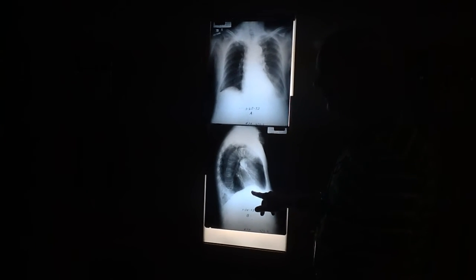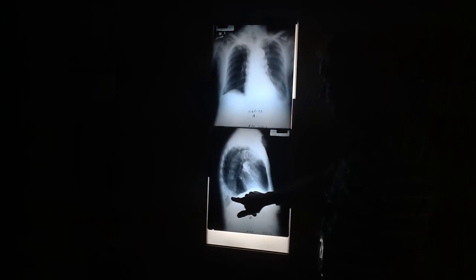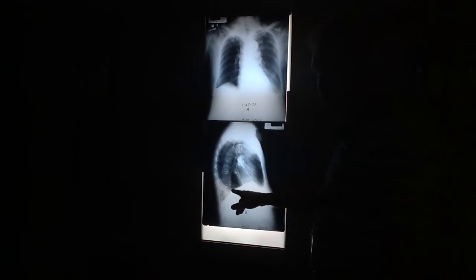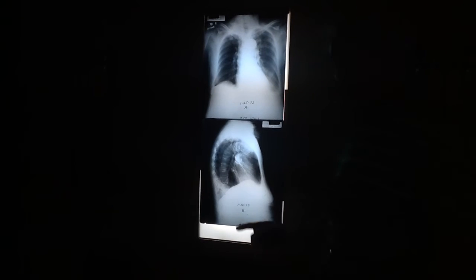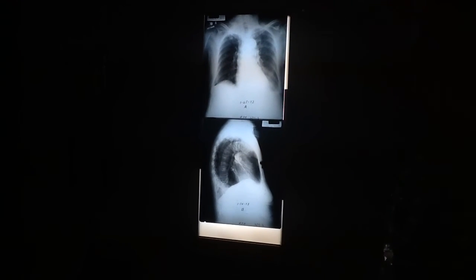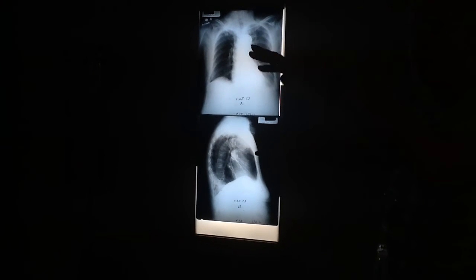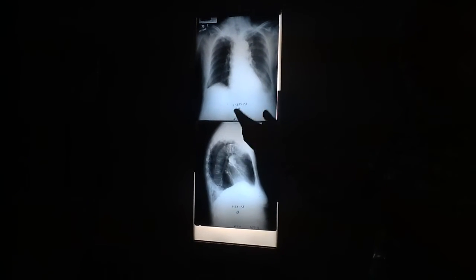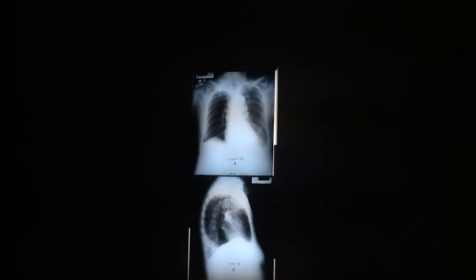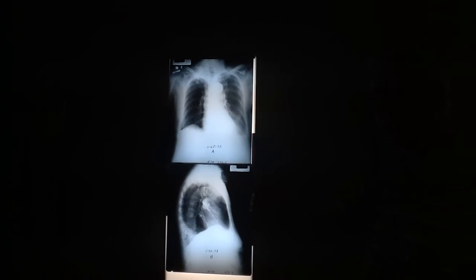That's a normal silhouette with the left hemidiaphragm. This is an abnormal silhouette with the posterior left hemidiaphragm. So yes, you can tell which one is which. And that's actually how you tell which hemidiaphragm is which, because the level doesn't matter. The level can change. If you did it left lateral or right lateral, the level's going to be different. It's which one do you see over the heart? That's the right one, because the left one gets silhouetted by the heart.